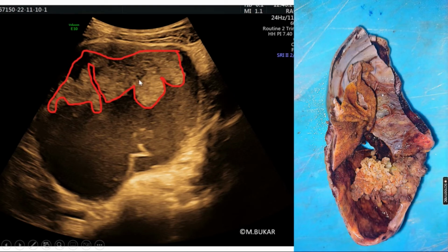So what are we dealing with? 1, 2. Look at the specimen of surgery. Clear demarcation of the two papillae, 1 and 2. So we have two papillary projections here. This is important when inputting this information into the ADNEX model because it has prognostic implications.